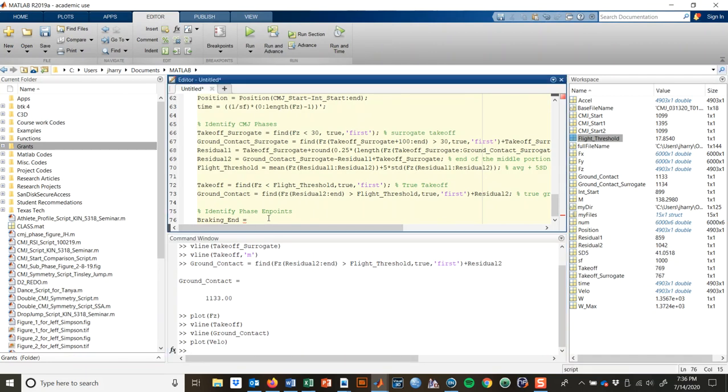All right, so what we're going to do now, because sometimes if you have a preload, velocity is going to go upward. That could be problematic, and you may think, well, maybe we need to start with a different phase. For this trial, because there was an unload, we don't have to, but you can easily reorder these phases depending on what we're working with.